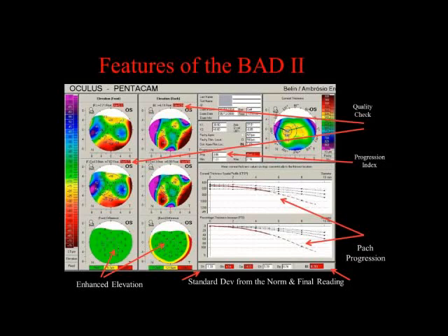That's telling you right off the bat that you don't have enough coverage to allow an 8-millimeter zone to be utilized. And this big red is letting you know you should retake the image. You'll even see the back surface is only 4.54. I picked this map specifically because it's bad. This patient either had ptosis or was blinking, but this is letting you know you have to retake it because this is an invalid map. It's only utilizing this tiny area here to compute a best fit surface.